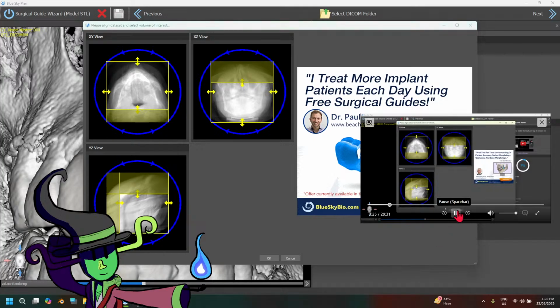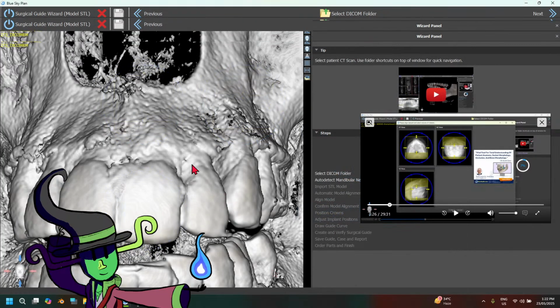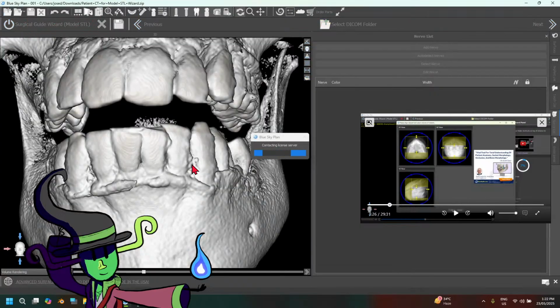On, and then click OK. Yeah, I should maybe also get rid of the neck here. Alright, I'm just gonna click OK.